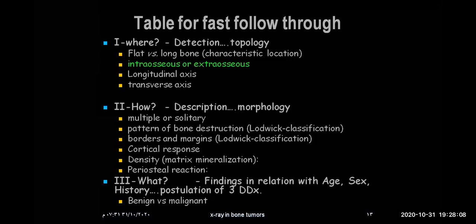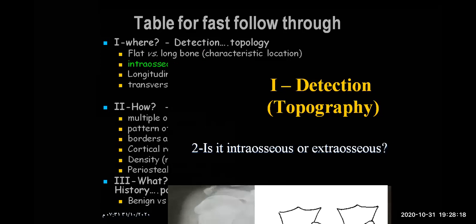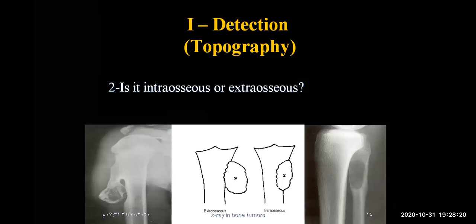The other thing, is it intraosseous or extraosseous? And this is just anatomical description. It can help sometimes, but it's the way of description like this. This is obviously extraosseous, and this is intraosseous. Okay.